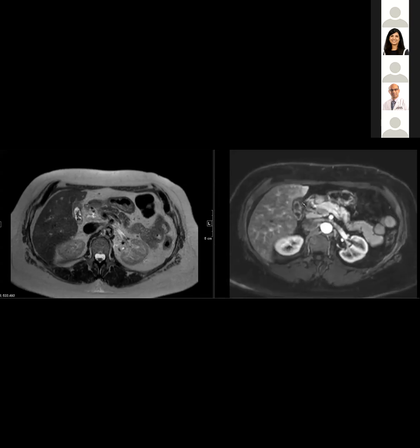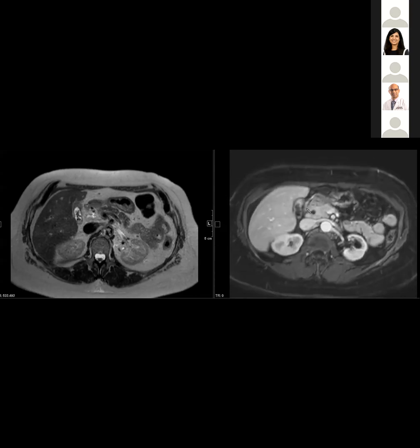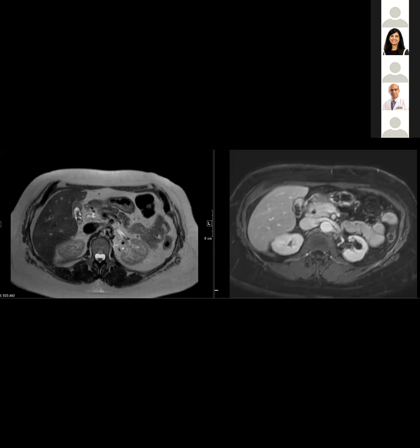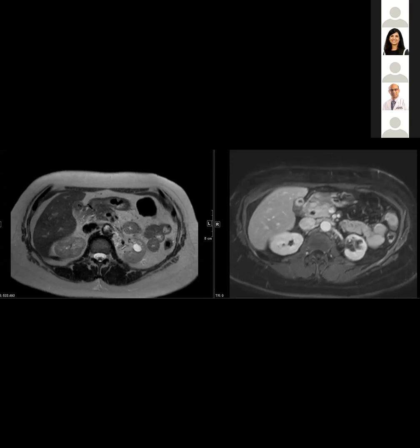You can see, kind of enhancing. And again, it wasn't called prospectively. I sort of, kind of... It's not a horrible miss, but. Well, I don't think it's a miss, Victoria, if it's addressed as adenomyomatosis, honestly, because more times than not, that will be adenomyomatosis. I wouldn't pass this myself, but it's not a miss to call this adenomyomatosis. That's a difference in opinion or whatever.